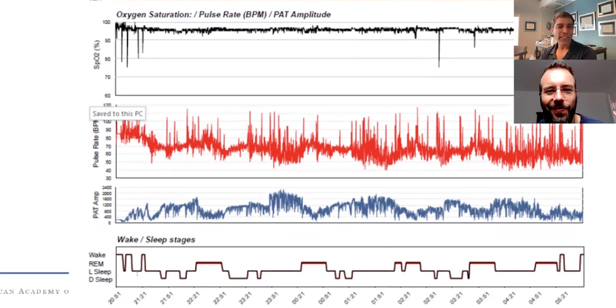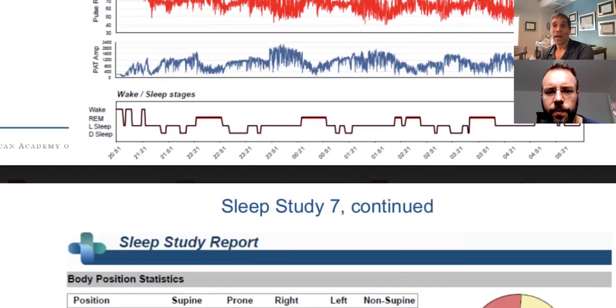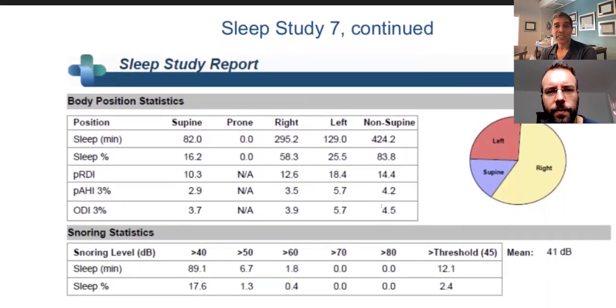And then awakenings, one, two, just three awakenings. That's it. And then one cycle, two cycles, three cycles, four cycles, five cycles. Great. And none of the awakenings occurred out of deep sleep. So not bad, maybe it's bad because they don't feel as much, possibly. And then you can see that it wasn't worse in the supine position, but here we go. This looks like more of a nasal problem, possibly, right?